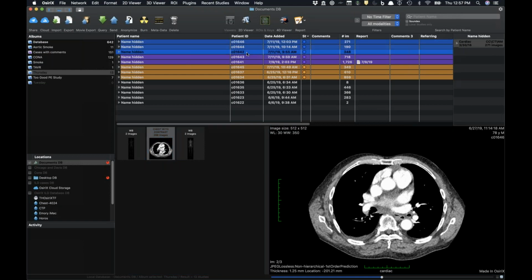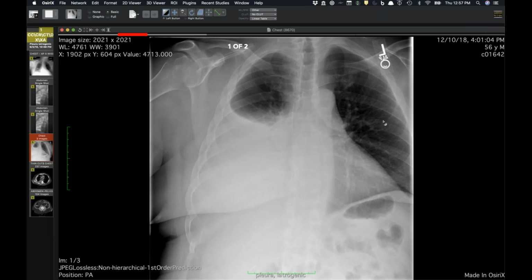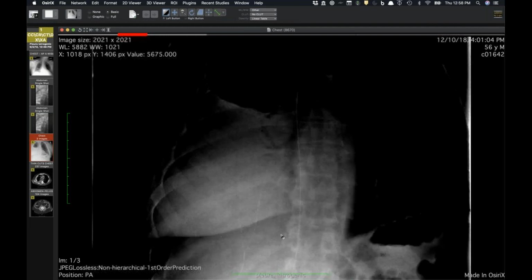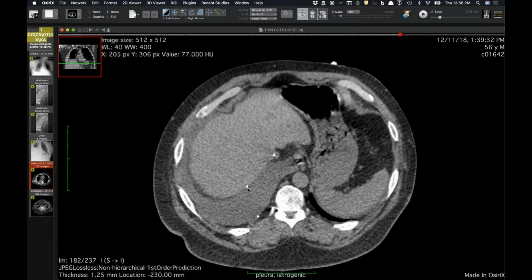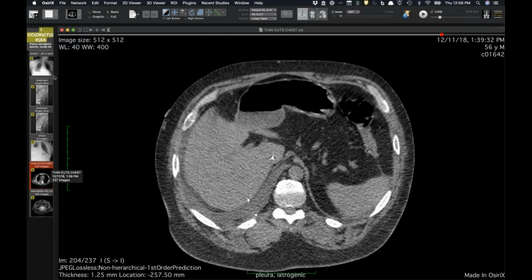It's kind of fun. Two cases really quick. This is an interesting case. This was one at the end of last year. This patient presented to an outside hospital, about 12 years post-renal transplant, with acute onset of right-sided chest pain. And you can see that there's something that shouldn't be in the brachiocephalic vein going through the heart into the IVC. There's also a second metal fragment here of a catheter or of a wire. No surprise, this was a hemothorax at the outside hospital. And you can see the catheter fragment that's in the right pleural space, separate from the one that's in his vena cava.